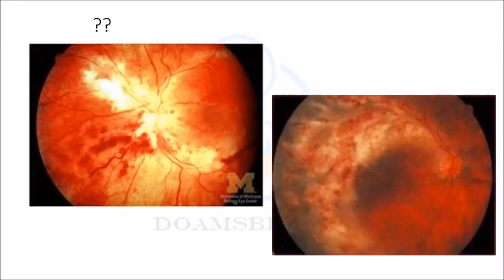Could it be? Sir, yes. Choroidal retinitis, yes, it would be correlated, especially the second one, as there are pigmentary changes also. But here, pigmentary changes are not grossly visible. Okay, correct. So which one will be the initial stage, and what will be the later stage? First picture or second picture? First one, initial. Maybe first one initial.